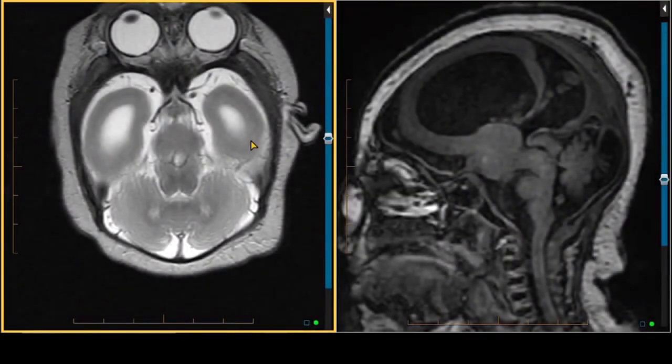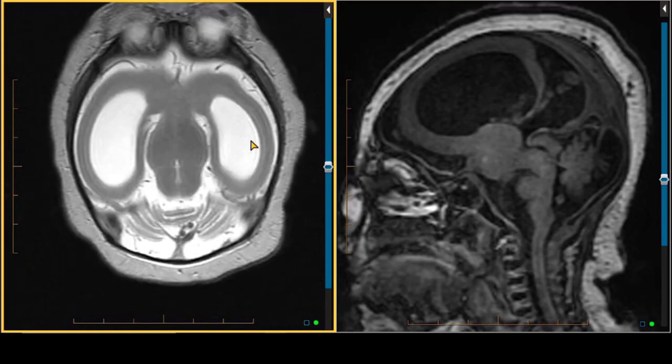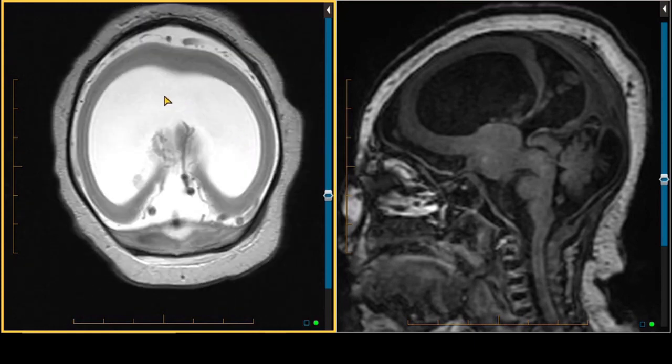This is an MRI of the brain in a newborn, in a child who had an abnormal fetal ultrasound. We can see right away that there's an abnormal configuration of the ventricular system on this T2-weighted image. So there's a monoventricle. There are no two separate lateral ventricles. There's one big, relatively amorphous ventricle. Additionally, we don't have any interhemispheric fissure. The cortex, which is relatively featureless, of one cerebral hemisphere goes all the way over to the contralateral side.